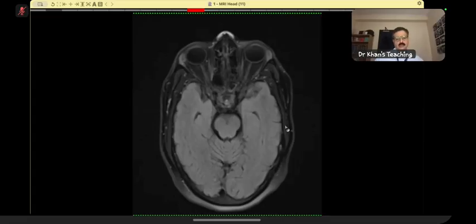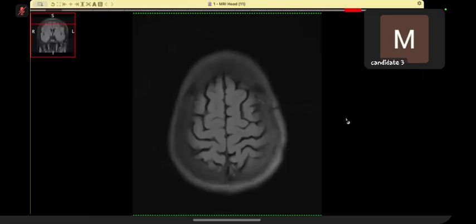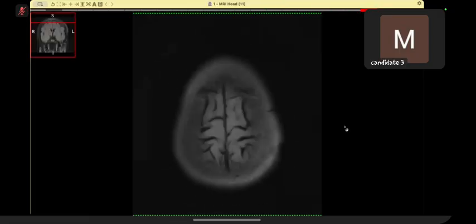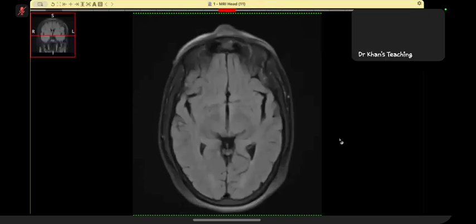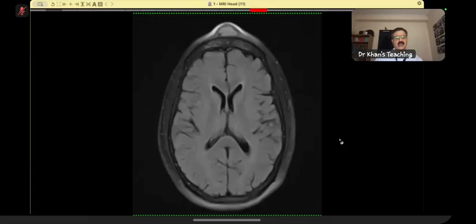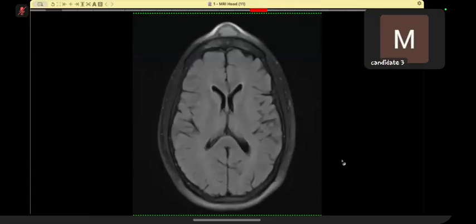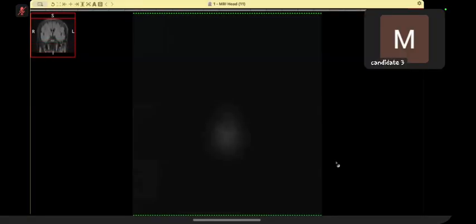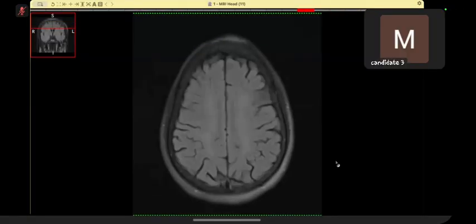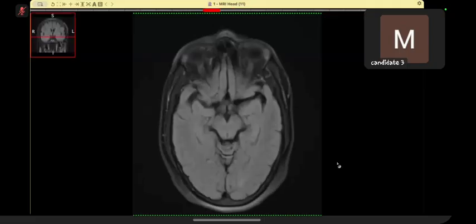Over to you. This is an axial MRI brain FLAIR image of a 68-year-old patient with a history of fall, followed by hematoma, which was not intracranial, it was a scalp hematoma, which is not resolving despite conservative management. I will scroll till the last cut. I can see that in the intracranial structures, there is no hydrocephalus, no midline shift or mass effect.